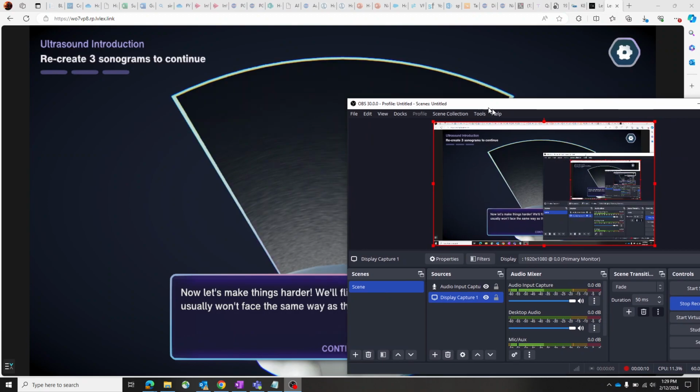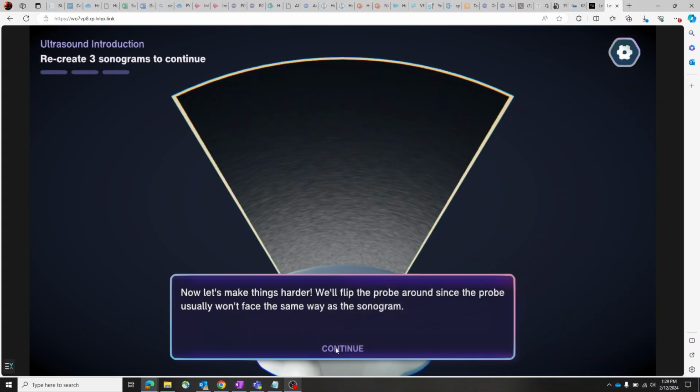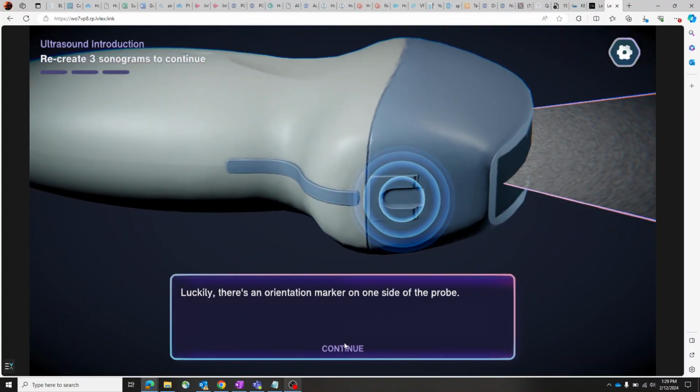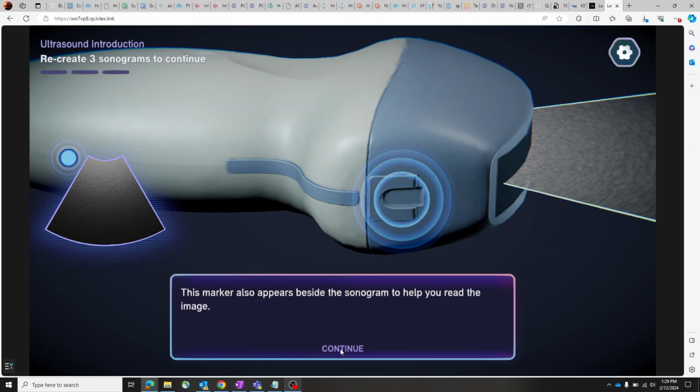So here you can rotate. Slowly learn to find landmarks to orient themselves towards this object, and then make a decision as to what they see here. So hopefully, yes, get across, find landmarks, and decide.